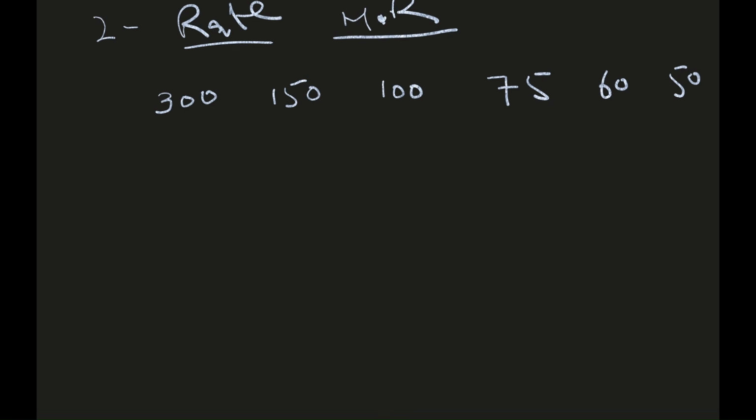Now, if you remember, I told you there was a small square, and a combination of five small squares becomes a bigger square. Then there was another five squares. They move along the x-axis and make a pattern like this.